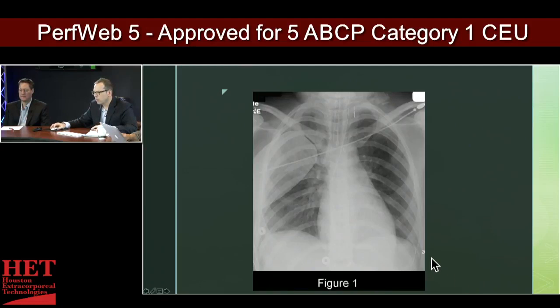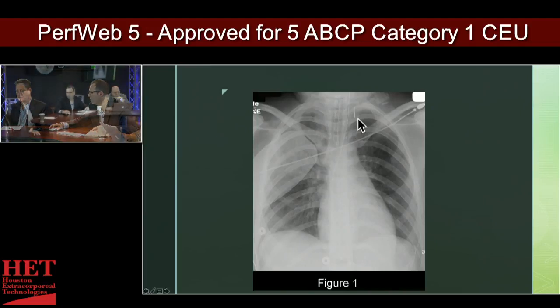And the other one may be way down here. We just can't see it, or it may be out here on lateral on the chest wall, inappropriately placed. But this is also a balloon pump, and this balloon pump is obviously too high. I thought it would look like a balloon pump. You still get two choices as to where this balloon pump is going. It's either going in the carotid on the left side, or it's going in the left subclavian. And based upon where this is headed, this is probably going into the left carotid. So this person may not wake up very well if, in fact, this balloon pump is functioning. Wow.